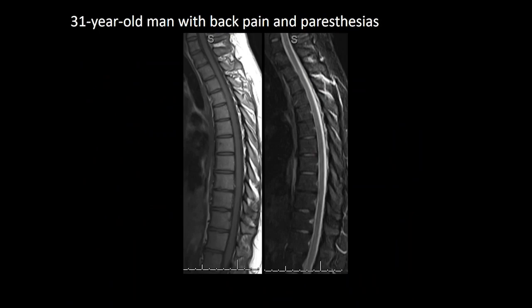We discussed intramedullary tumors, we discussed intradural extramedullary tumors, and when we move on to the extradural tumors, these are largely bony in origin, but sometimes you see other tumors and you might find this to be an interesting one. A 31-year-old man with back pain and paresthesias. Notice that you have sagittal T1 and STIR images shown. On STIR images, the extradural fat that you see should be completely effaced in a normal person.